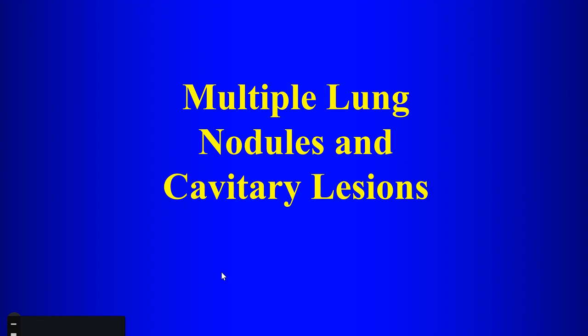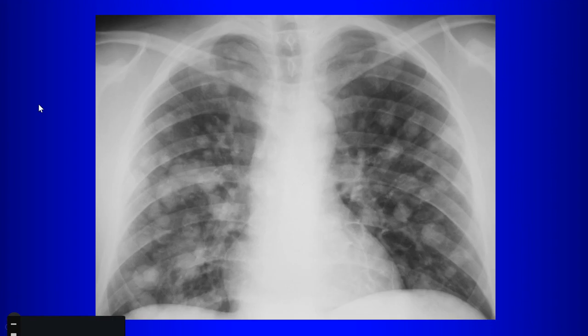All right, so today we'll talk about multiple nodules, the approach to that. So what's the finding on this chest radiograph? You would call those consolidations, given the topic of the lecture? No, but like, if I saw it. If you saw it, you'd say consolidations? I'd say they're masses. All right.